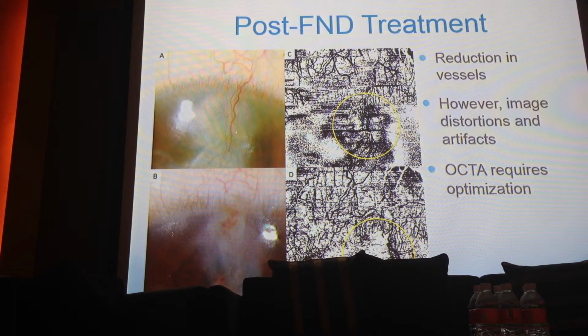Then you would argue, why can't you pick it up with the segmentation? Because then the superficial segmentation should show it, and then the deep. But somehow, when I took all the layers together, I just couldn't get that vessel. It's just a missing segment. Every time, I could show you 20 images, same images, and I just couldn't get that segment of vessel. Very strange. But it could be low flow. It could be really low flow. And why low flow and then it became fast?